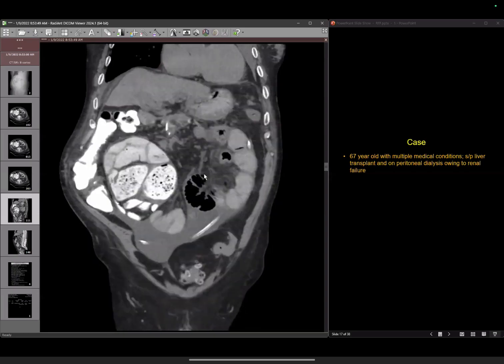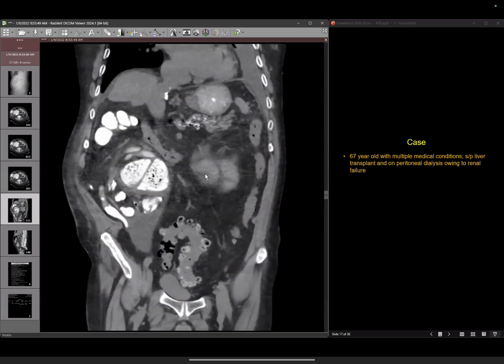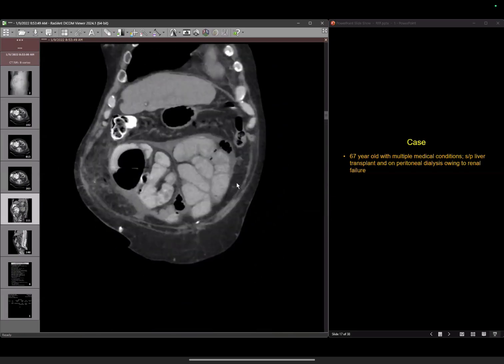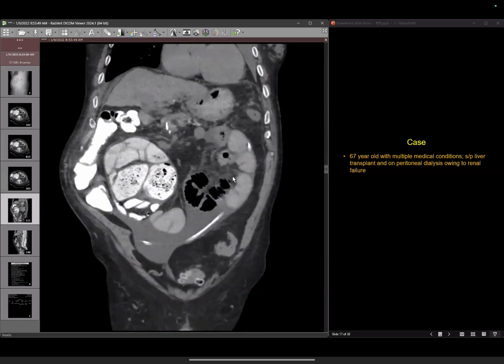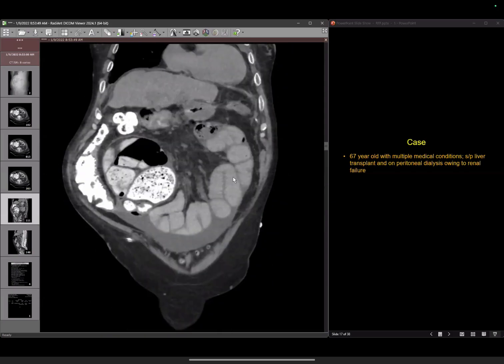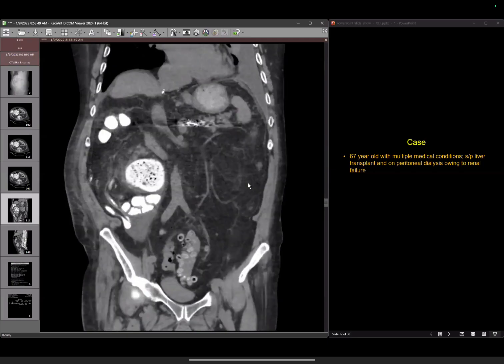Can be seen in patients with dialysis. Sclerosing encapsulating peritonitis, or what is also referred to as the cocoon forming. Yes, sir. Right. So what is the implication here? If you tell your nephrologist that I see sclerosing encapsulating peritonitis in a patient with peritoneal dialysis, what does that typically imply for these patients? Corticosteroids, role of corticosteroids in this.